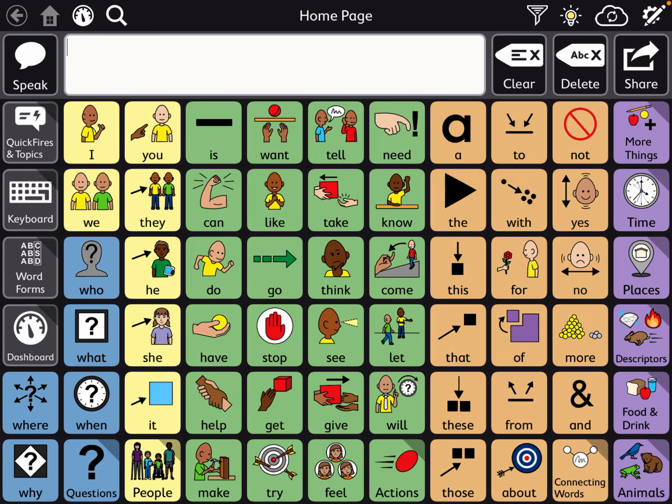This video will help you add a visual schedule or daily routines embedded into your TD Snap. This is specific to either Motor Plan or Core First. And this is how you get this done or where it is.